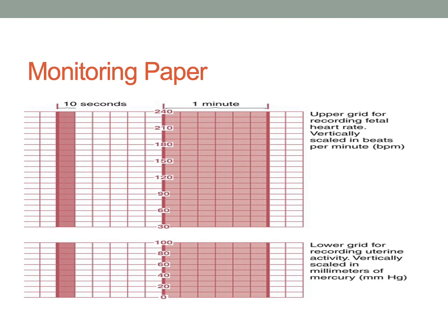If we are doing external fetal monitoring, the height of the contraction doesn't really tell us anything, because external fetal monitoring really does not measure the intensity. It just lets you know that there was a contraction. The only time that we utilize these numbers is when we have an IUPC, or intrauterine pressure catheter, which is able to accurately measure the intensity of the contraction. And we would count Montevideo units, which we're not going to cover, but it's just so that you know that exists.